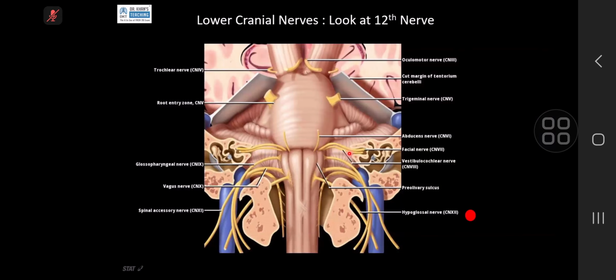This is the hypoglossal canal, which I was telling you. This is the sagittal sequence. This is the jugular tubercle. See how it looks like. It looks like an eagle, isn't it? So this is the beak of the eagle, and this is the jugular foramen, and this is the canal. They will show you cases in which this is eroded, or they can ask you on anatomy, where is the canal on a coronal.